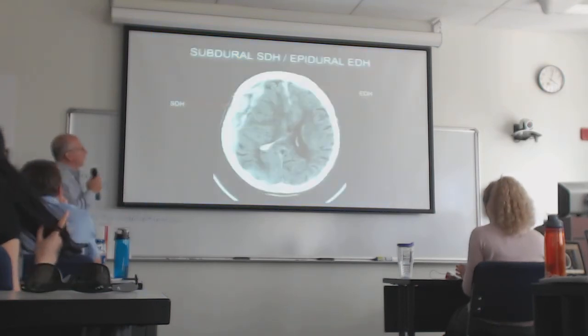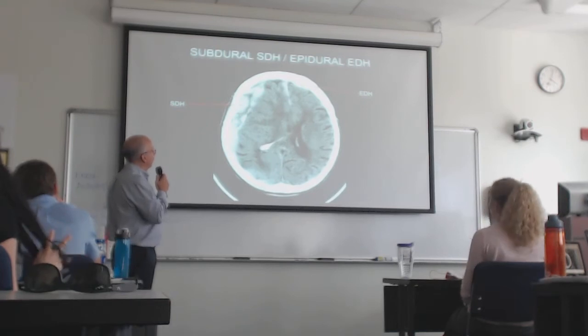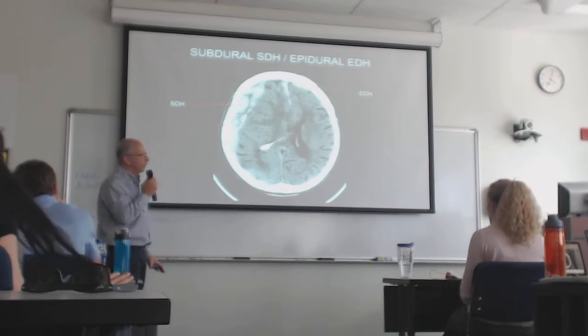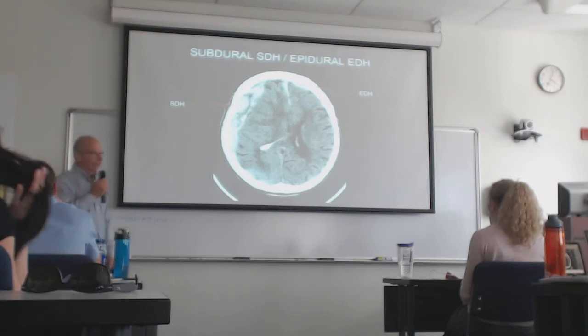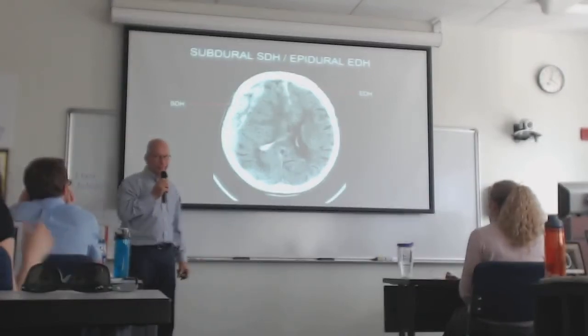Okay. This is an older CT scan, but it nicely demonstrates a couple of important findings. On this scan, there is both subdural hemorrhage and epidural hemorrhage.